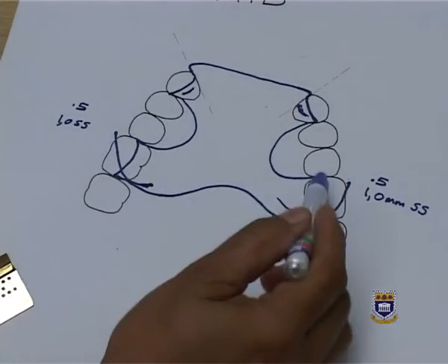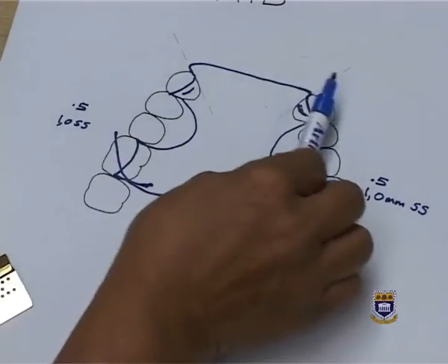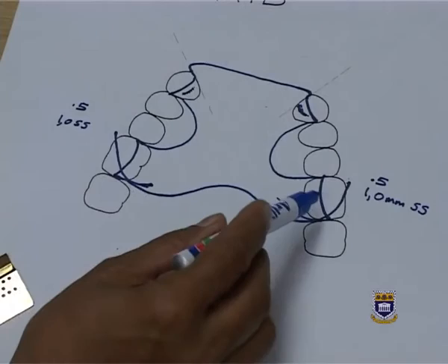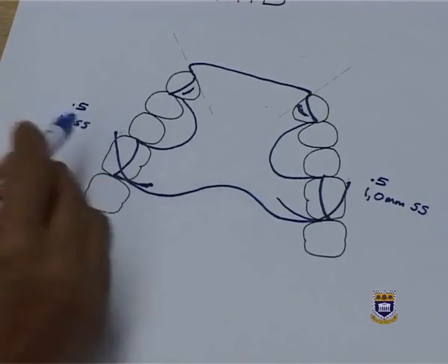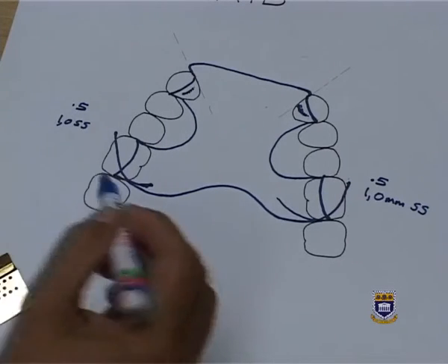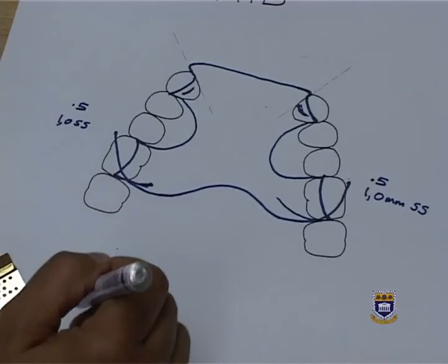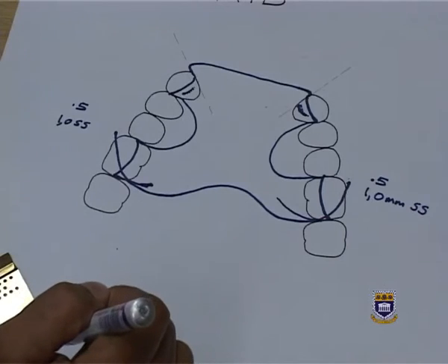Have I provided reciprocation for my active retainers, do I have enough horizontal stability, and have I connected my components correctly? When I look at this, this will be my acrylic partial denture for a class 4 denture, and all the instructions that I need to give to the technician, I will write down at the bottom.